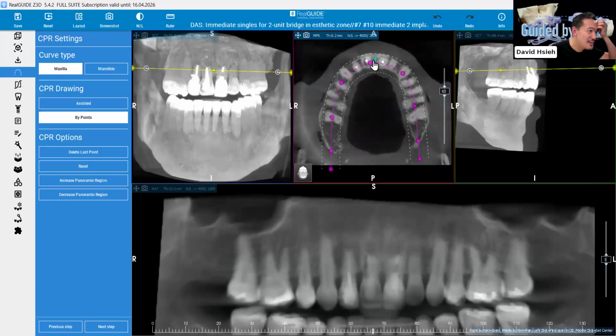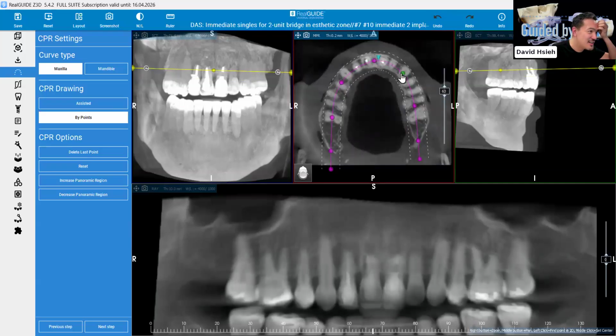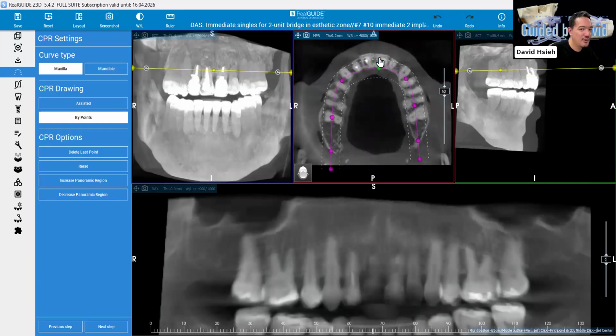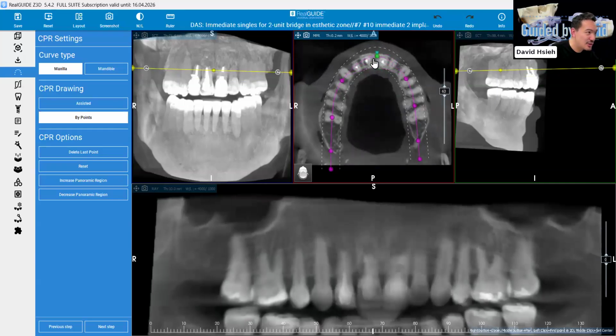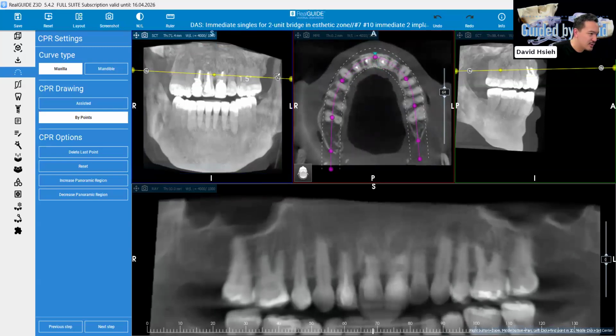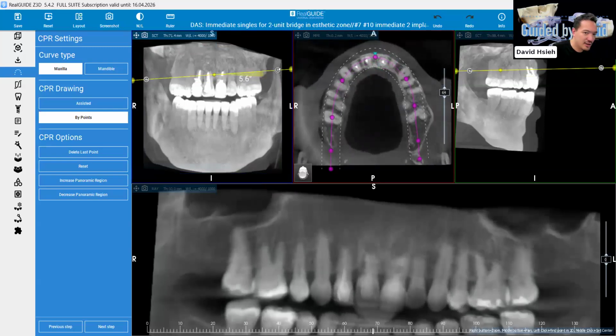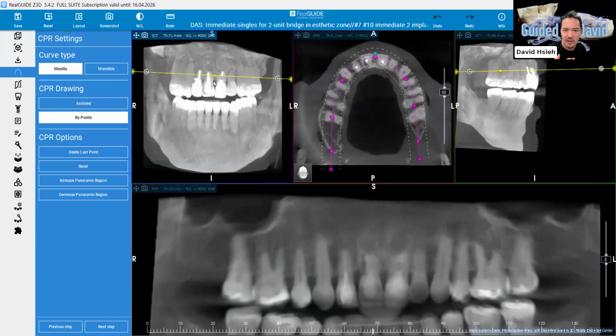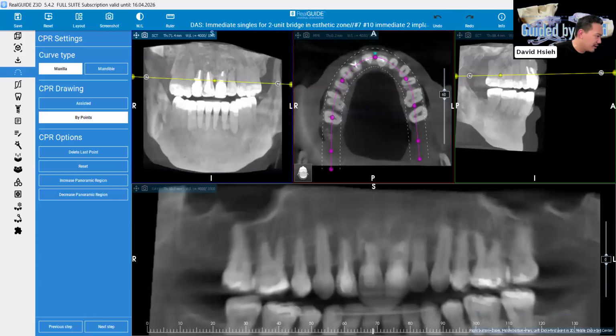And okay, the midline is not there. So I'm gonna change the arch, just tweak it a little bit, right? Based on how you tweak it, your panel view is gonna change simultaneously. How cool is that, right? Not to mention, an occlusal view, you can tweak it side by side. This is the good of the AI tool that right now we have, right? So just see next. We're happy with that.